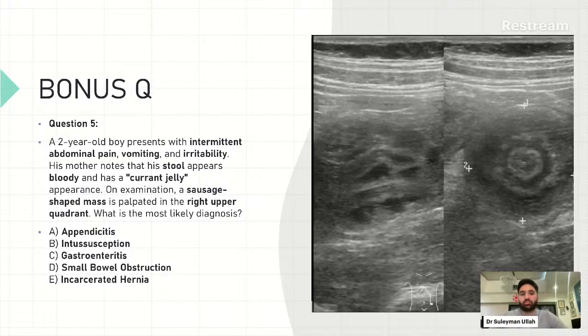It's what we call telescoping of bowel. So if you imagine a telescope, when you collapse it and put it together, it all kind of collapses into itself. That is essentially what intussusception is. And we do see it in young patients around 2 years old. But it can actually be seen in older patients. I have actually seen it once in an older patient, and it causes small bowel obstruction. And you can see it very clearly with this sign as well. So, it's not exclusive to pediatric patients, but it's a key one to look out for if you have a pediatric rotation.